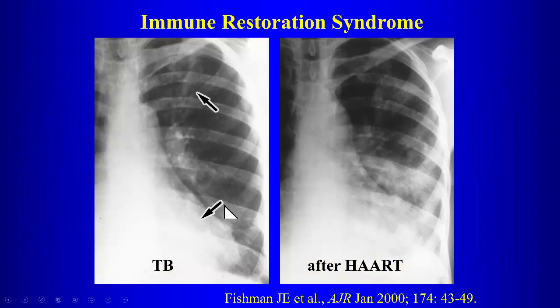Okay? So patient with TB, after starting antiretroviral therapy, it looks like there's worsening of disease within the chest in this patient, even though they're also being treated for tuberculosis.